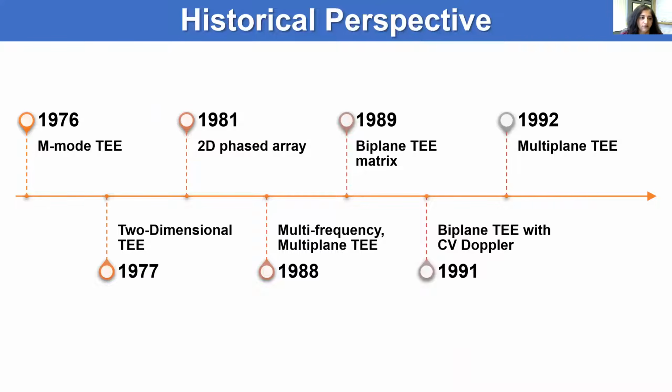The field of TEE really has its basis in the relationship between the esophagus and the heart. Because the esophagus lies directly behind the heart, the TEE transducer inserted into the esophagus will be able to overcome the limitations of chest wall imaging: soft tissue, rib spaces, air. That is really the goal of TEE.